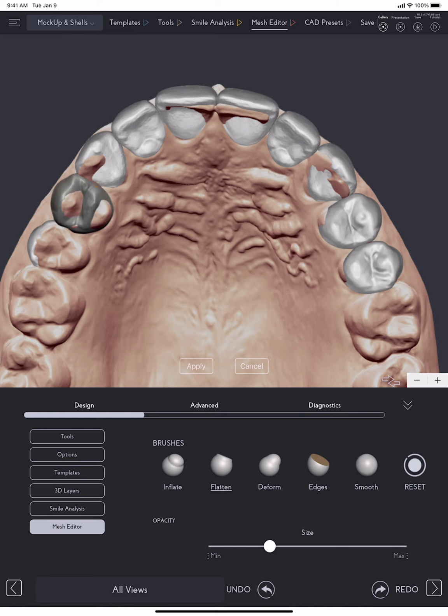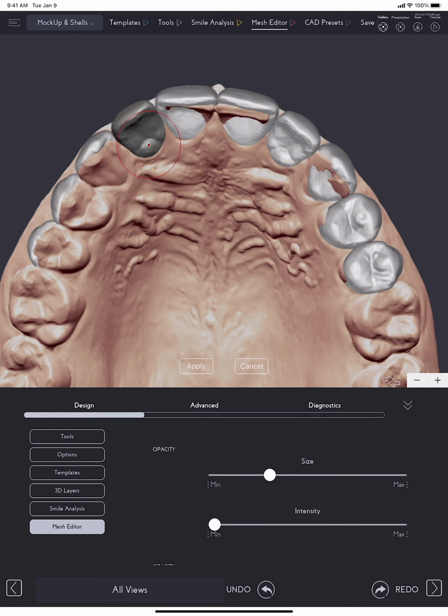Now, if you don't want such a huge effect on the teeth, you can reduce the size or the intensity. That's fine. We're gonna let the laterals like this. I just used this kind of high intensity just to be quicker than normal, so that we can delete and do everything here in a short period of time.